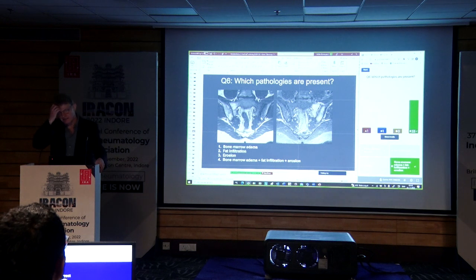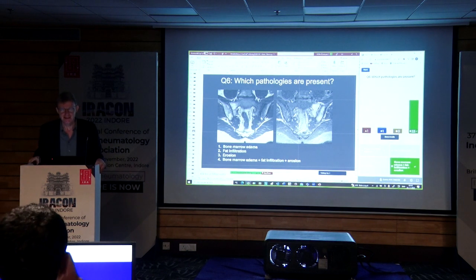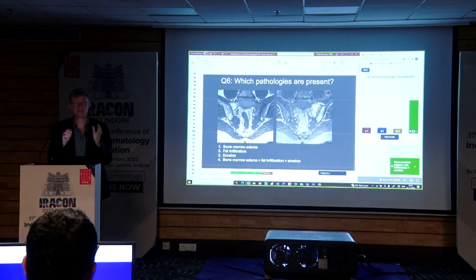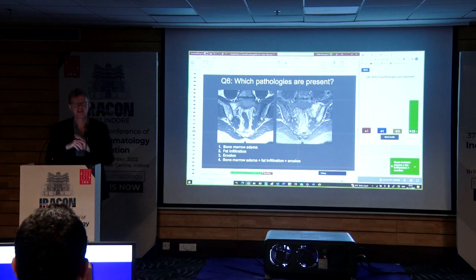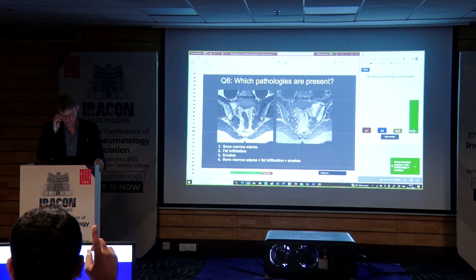And the interesting part is, now I actually do have the x-ray for this, and I'll show it to you in the break. The interesting thing is that this x-ray is 100% normal. There's absolutely nothing to see, illustrating that there are things you see by MRI and not X-ray.